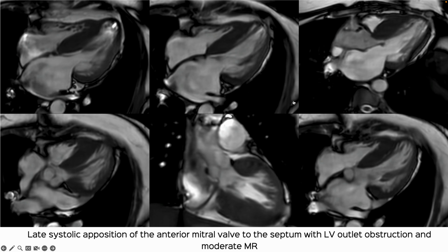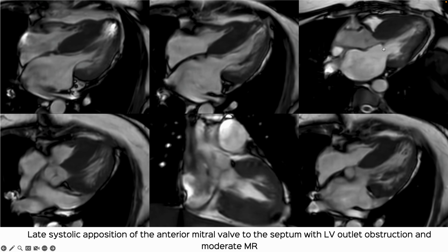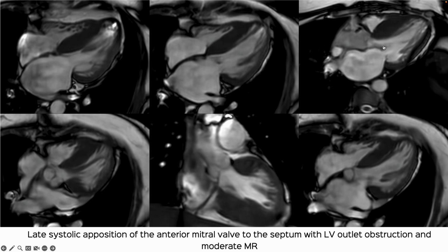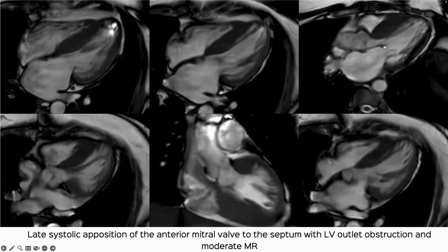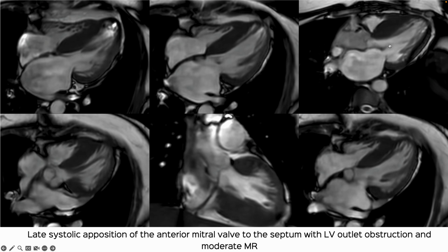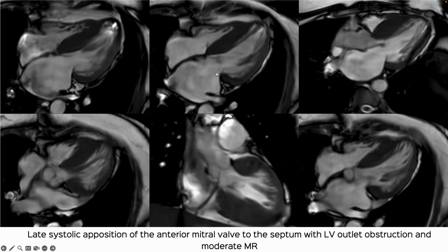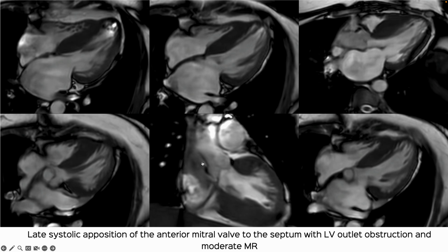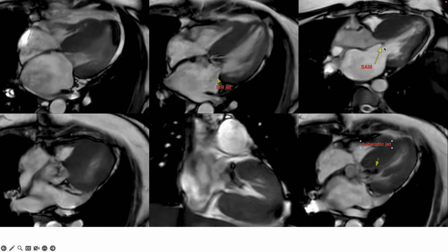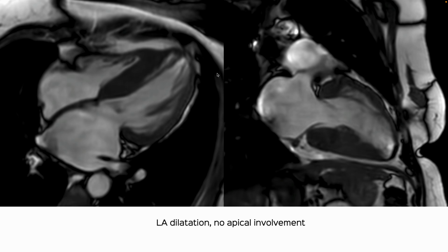Then when we look at the cine 4 chambers and the LVOT views, you can see the late systolic apposition of the anterior mitral valve leaflet to the septum. There's this jet seen here because of the apposition, and we see a mild to moderate mitral regurgitation. The LA is also dilated, and if you look at the cine images, we can appreciate the SAM, the subaortic jet, the mitral regurgitant jet, etc. So that's the next finding that we have.